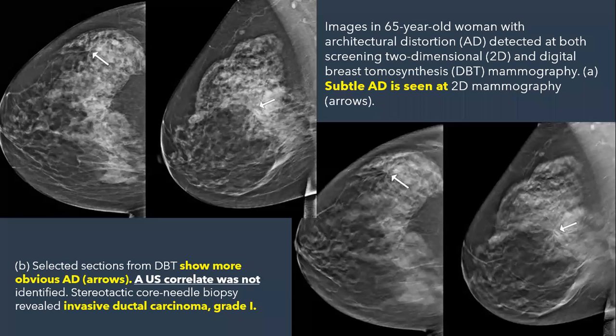How many cases do we miss from the 2D mammography? Medina? We miss a lot, yeah? Yes. If this is invasive breast cancer, definitely in this complex parenchyma, we miss a lot. Do you agree? Yes, agree. Totally agree.